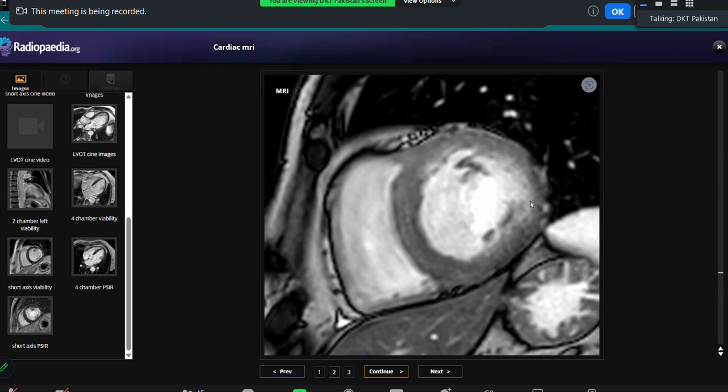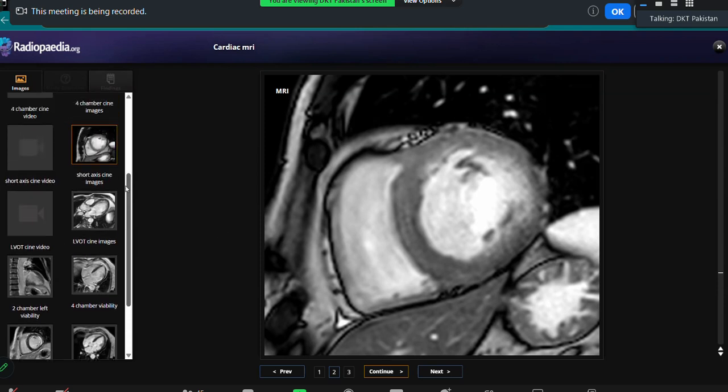Okay, the standard measurements vary between male and female. Usually, if it is around 5.8 to 6 centimeters, and if it is more than that, then it means it is a dilated ventricle. Okay, so this is for that. And yes, you're correct. Your description is really good. There is some hypokinesia for other people as well.